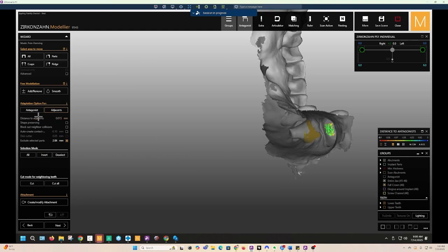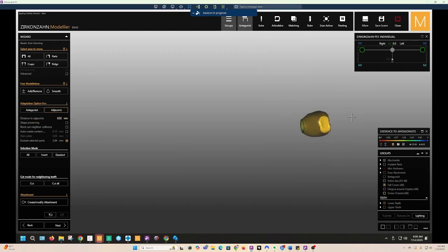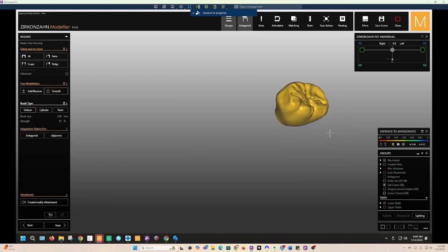You can see here. No, that doesn't look like 0.015. 0.02, sure. Let's cut again. You can see, yeah, that's looking better to me. Let's go 0.02. 0.03 is the rule, but I want to be a little more aggressive. And now you can see we still need to.